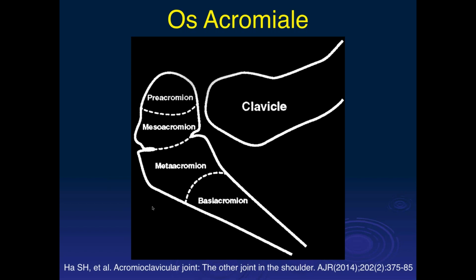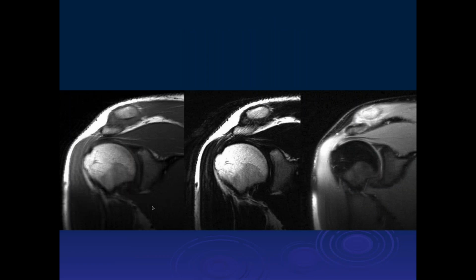All right. Okay. Another thing to look for is inferior placement of the acromion with respect to the distal clavicle. And I don't know if these are due to old trauma or whether this is congenital, or presumably it could be both. I just kind of presume that this is congenital. And you can see instead of the acromion process being parallel to the distal clavicle, it actually articulates underneath the clavicle. In this case, with a little bit of edema in this area.